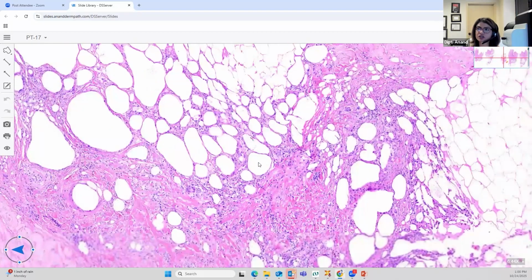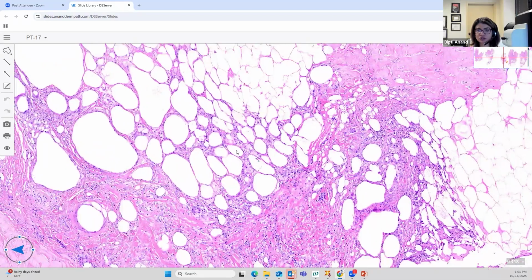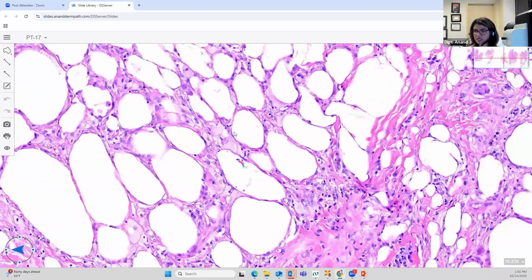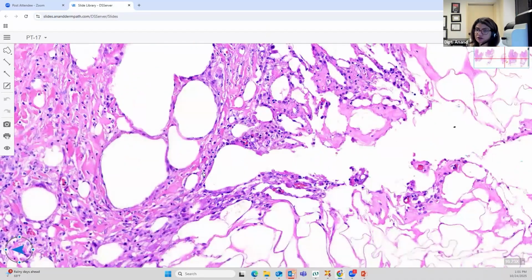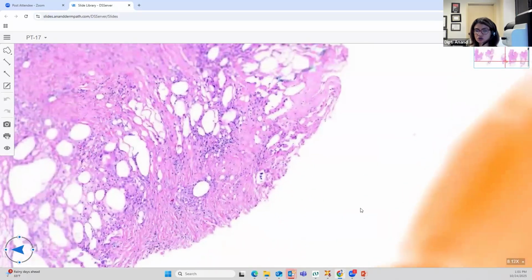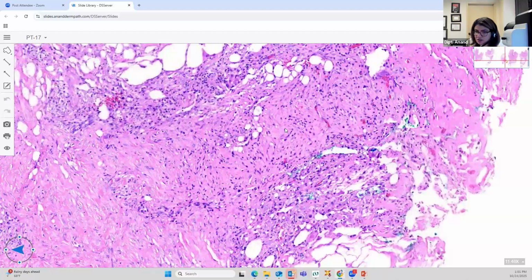It is typically not very neutrophilic. So you don't get the infectious look to it, but you do get the foamy histiocytes, which are gobbling up the fat. There is often going to be old blood, so there's going to be hemosiderin. There is often granulation tissue formation. So very loose looking fibrous stroma. As you can see in here, there is granulation tissue formation.